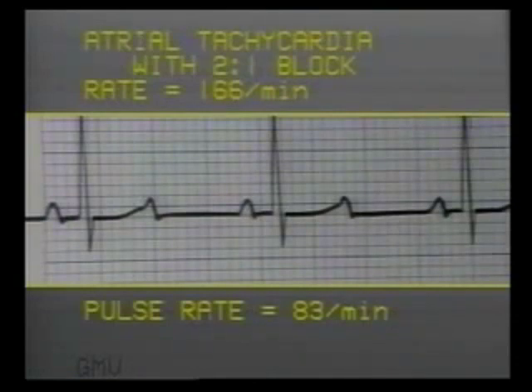That is, in a 2-to-1 block, ventricular rate is exactly half the atrial rate. So clinically, a patient with supraventricular tachycardia with block will not have a rapid pulse rate. Only ECG will demonstrate the atrial rate to be about 160 to 220 per minute.